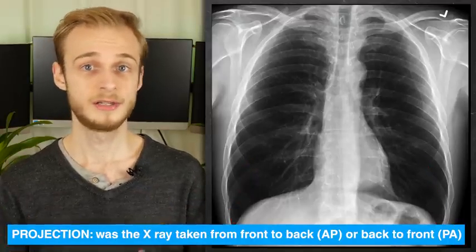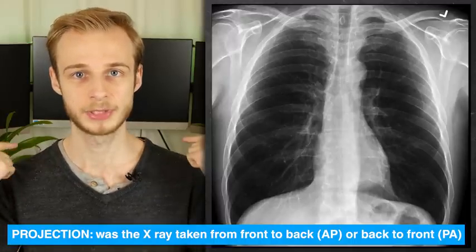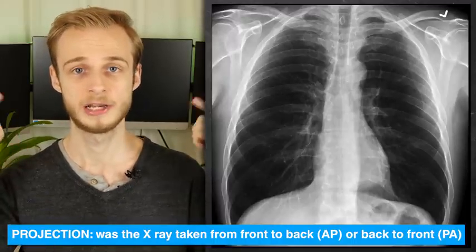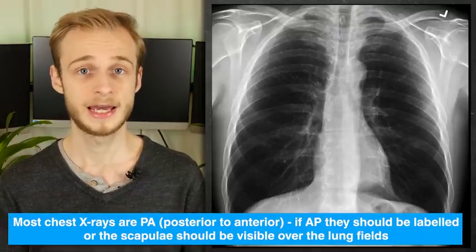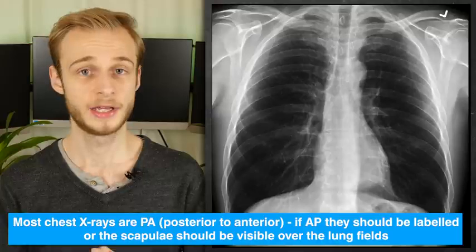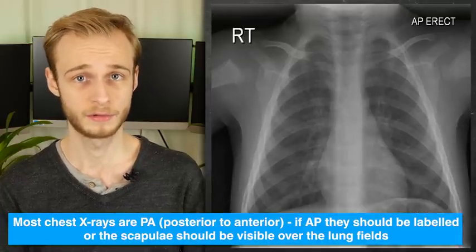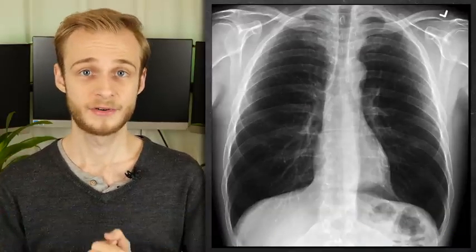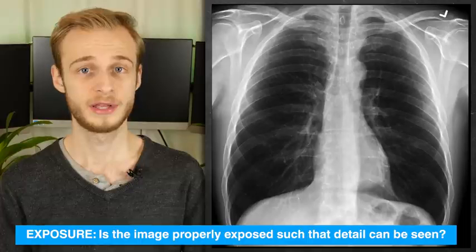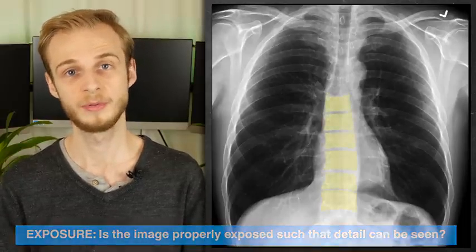P is for projection, and all that tells us is whether the x-ray was taken from anterior to posterior through the patient or posterior to anterior through their back. Most chest x-rays that you'll see are PA. This is convention normally, and the only reason to think otherwise is if you see the scapulae projected over the lung fields or the x-ray is labelled as being AP. Lastly, E is for exposure, checking that we can see everything that we need to see, and the way we tell this is whether the vertebrae are visible behind the heart.